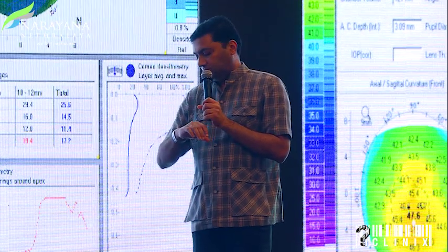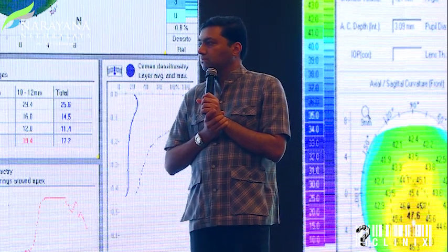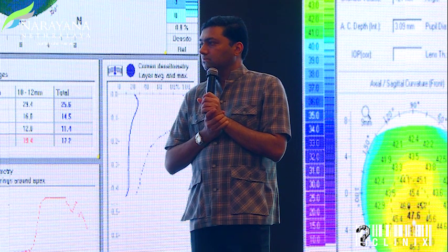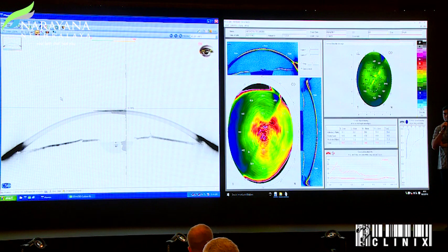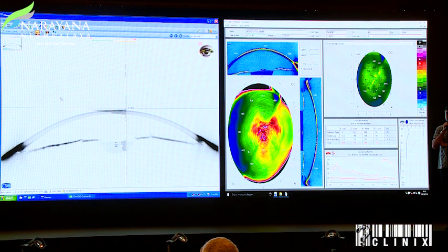As an example, most of you will be able to tell the difference just by looking at the map, but if you have someone who comes in with corneal edema, the BAD display will be worse than it was before. It doesn't mean they have progression of keratoconus. If you look at the example I showed on the map on the left here, the second column, the one to the right of the blue circle on the bottom, that's the BAD-D final parameter, and I probably can't read it, I don't think you can, but basically they're all 7 point something. They haven't really changed a huge amount.